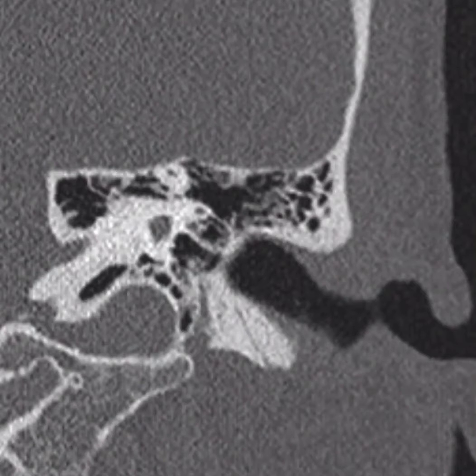Here we have a coronal CT through the temporal bone. The external ear or pinna is seen here, opening up to the external auditory canal right here. The external auditory canal consists of an outer fibrocartilaginous portion here and an inner bony portion seen here.